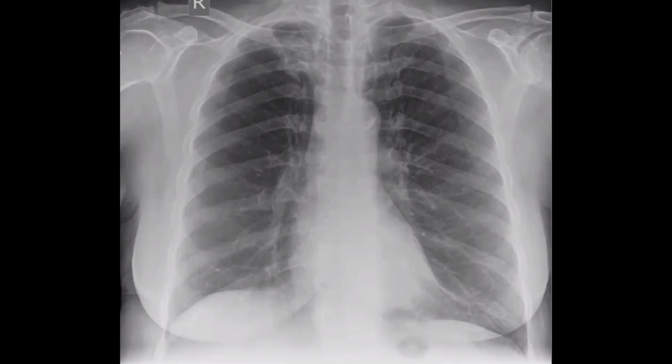X-ray chest frontal projection of a mature skeleton, in which I can see the bilateral lung fields appear predominantly okay. The heart size is okay. The costophrenic angles are normal. The bones appear grossly unremarkable.